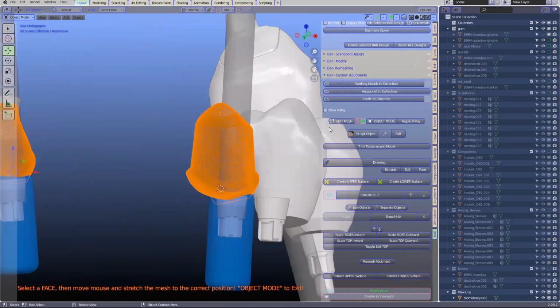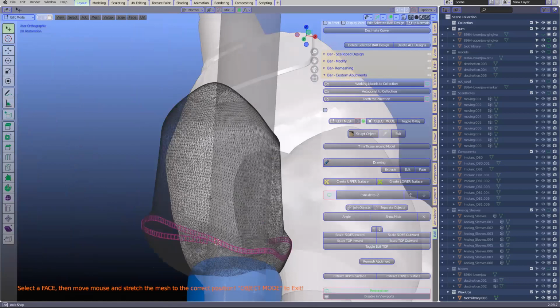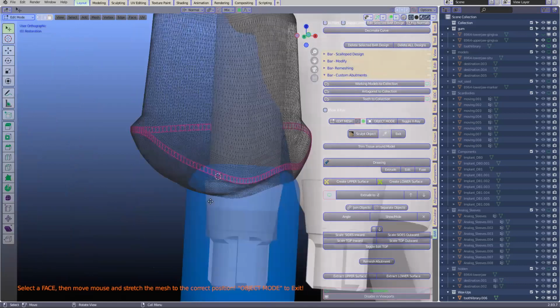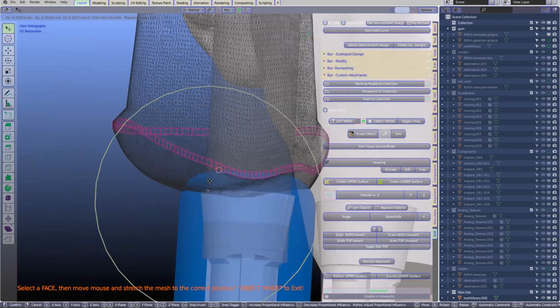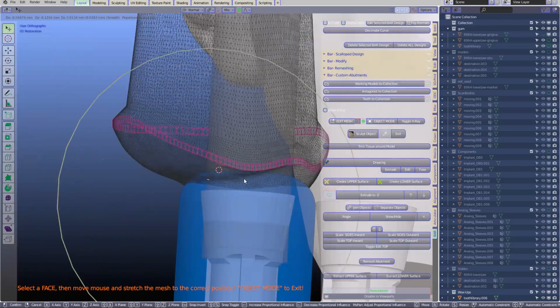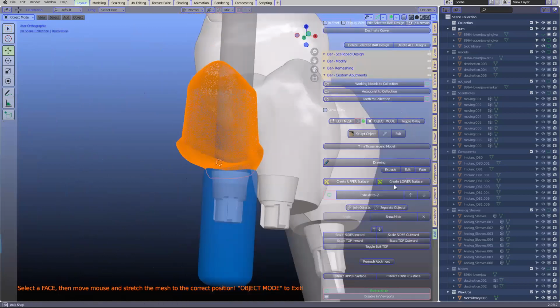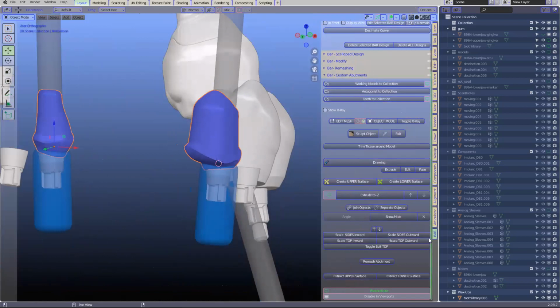You can't move that. No, you can move it. You can pull it out or whatever as much as you like. But here, for example, we are too low, you see. That's right, we are too low, and there's nothing you can do. If it's going to be a little bit high off the gum, well, what can you do? Yeah. Okay.